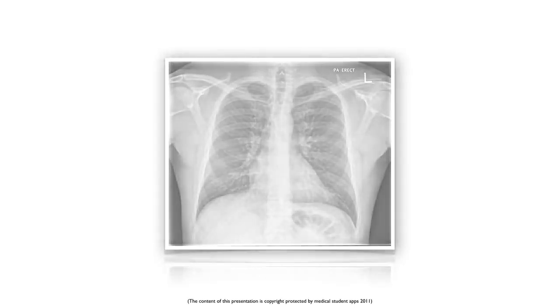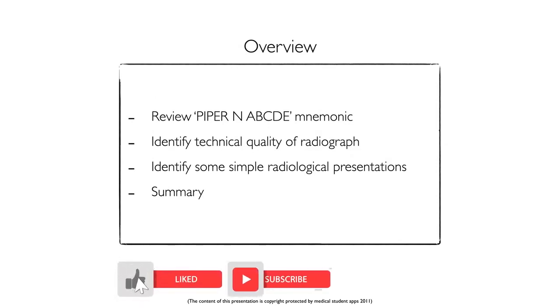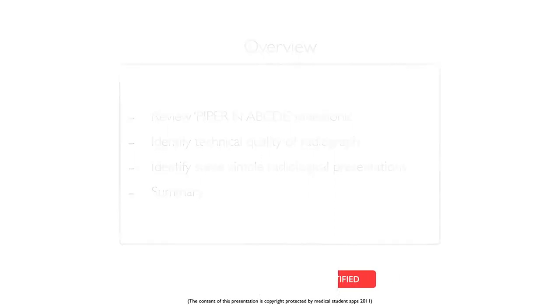Welcome to Medical Student Apps Chest X-ray Interpretation. In this video tutorial, you will learn how to apply the Piper N ABCDE mnemonic to assess the quality of a chest radiograph and to identify simple radiological presentations. We will now begin by reviewing the Piper N ABCDE mnemonic.